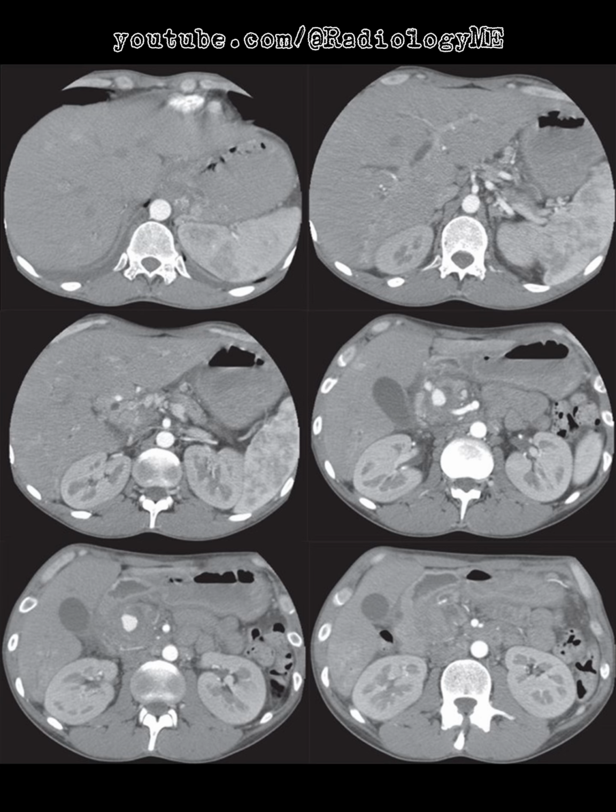Given the findings and their potential implications, I'd want to correlate with clinical history right away. A prior episode of pancreatitis would make the pseudoaneurysm diagnosis much more likely. In the absence of such history, I'd keep malignancy or an infectious vasculopathy on my radar. Because of the potential urgency here, especially considering the size and nature of this vascular lesion, immediate discussion with an interventional radiologist would be my next step.